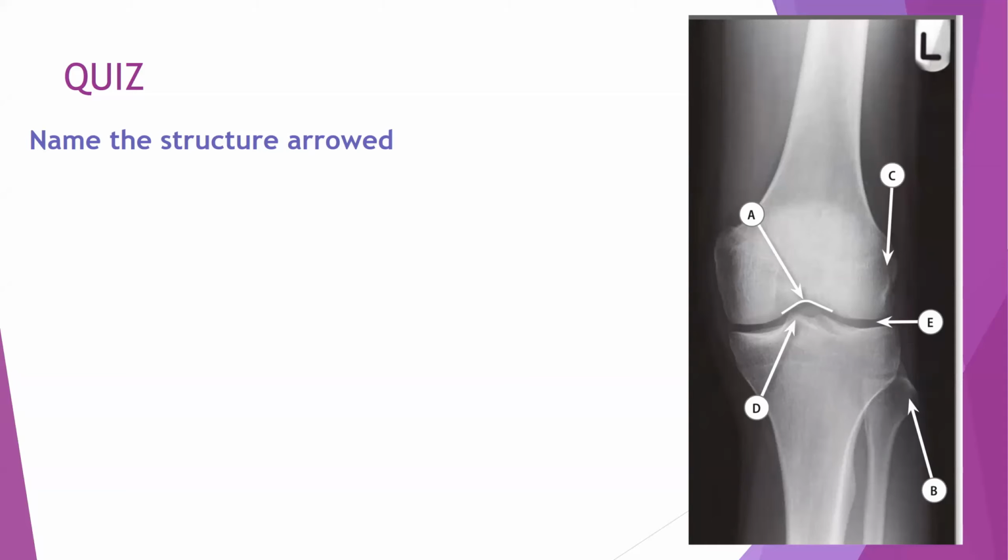It is the intercondylar notch. Excellent.